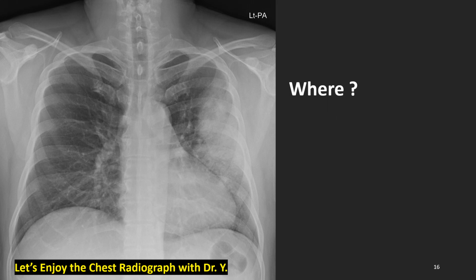From this slide on, we may confront some difficulties with localization of anatomy, lobar anatomy, because the silhouette sign has one precondition, that is whole involvement, not partial involvement, homogeneity of the pathology. Okay, let's start with this patient.